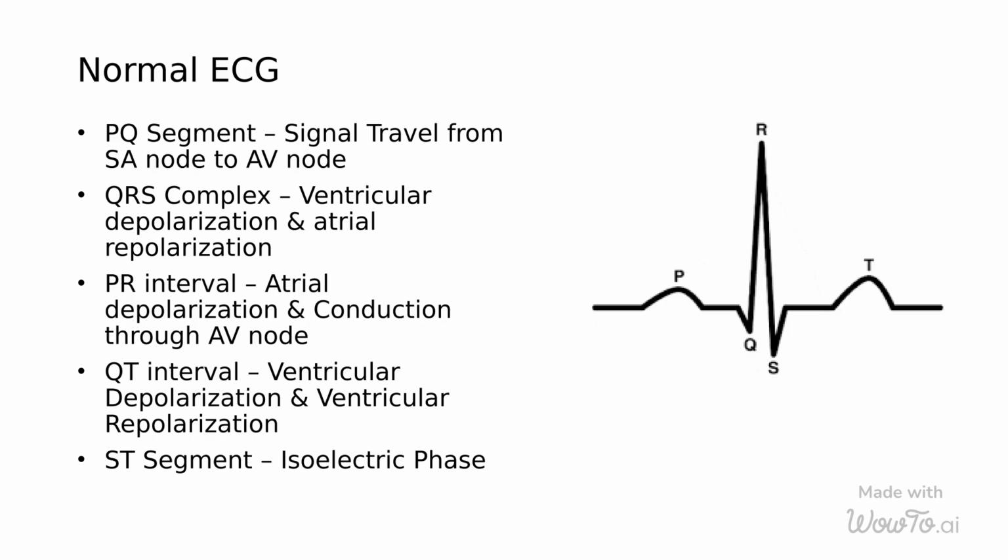The QT interval represents the time for both ventricular depolarization and repolarization. It starts at the beginning of the Q wave and ends at the end of the T wave.